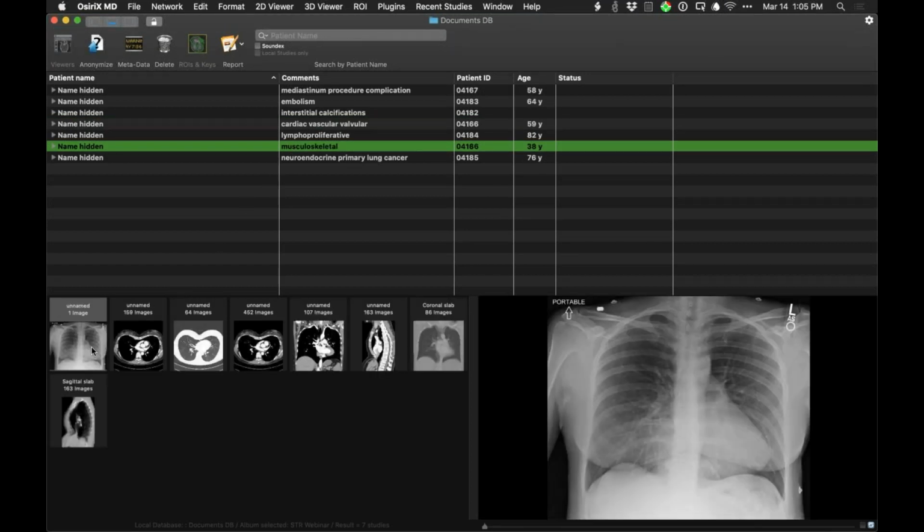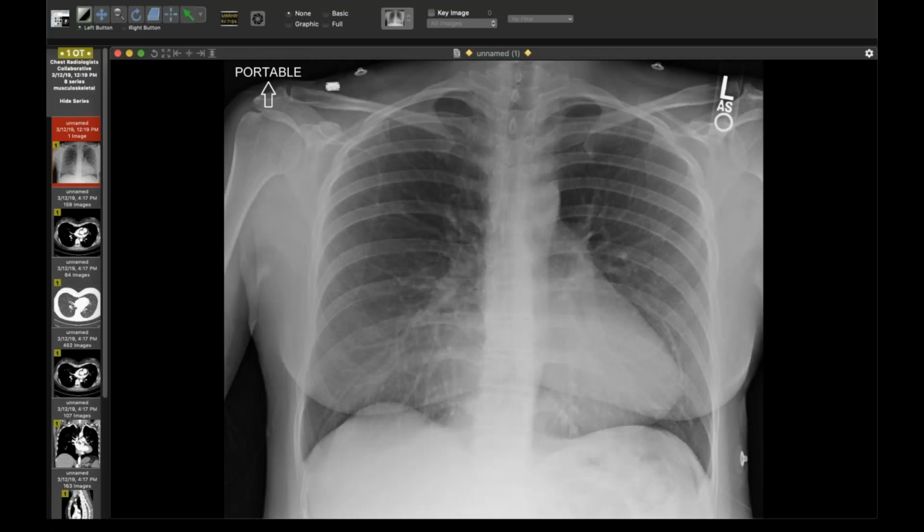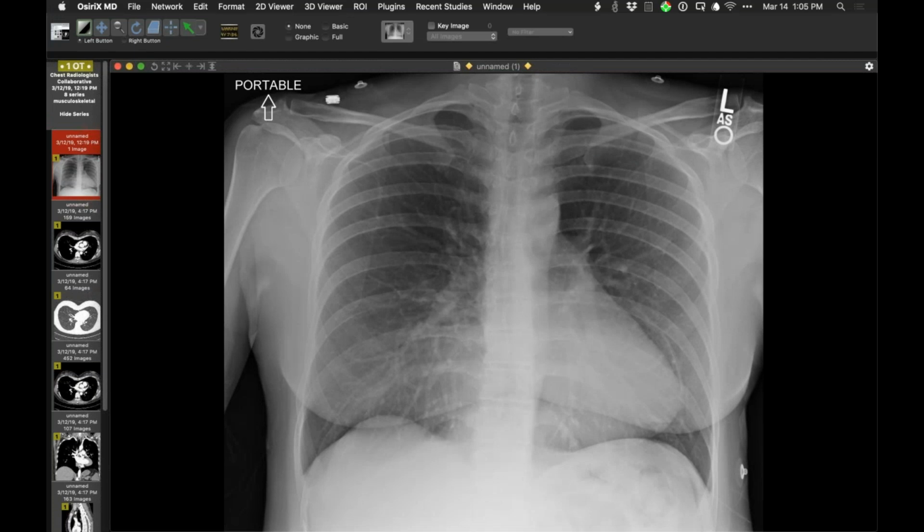This is a nice case for David. He's shown this before, but this is such a nice example, I thought I would show another case. In looking at this frontal projection of the chest, there are a couple findings that allow one to suggest a particular chest morphology. First, the heart. We see less of the right atrium to the right of the spine than one usually does. So the heart is a little bit pushed leftward, or is located a bit leftward.